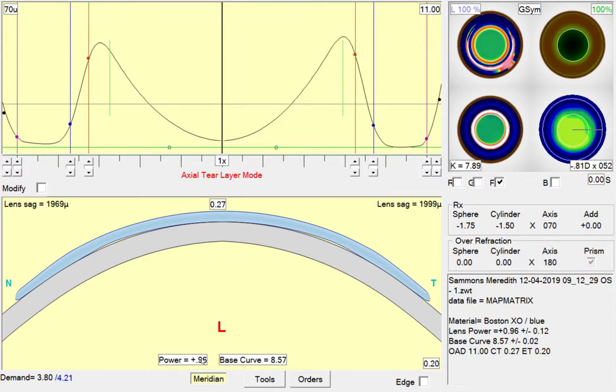Out here, you can see that after having moved the point out, our power dropped, and our base curve is a little bit steeper than before. We were at 1.2 before. We have to readjust this, and we also know we want to go a little bit flatter than original. Let's say we go a quarter flatter and aim for a target of plus 150. So we just need to click up here a few times.